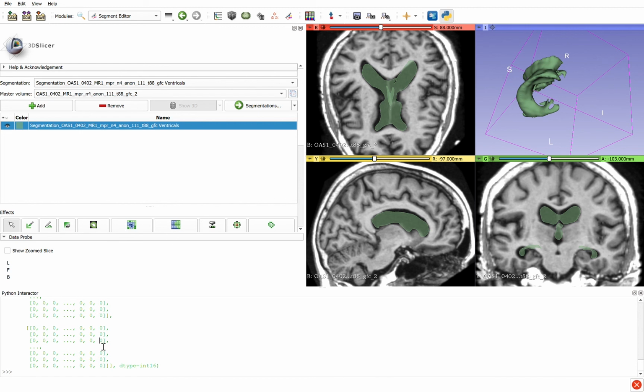We're going to create a new file name which is just the MRI file name up to 12. I want you to do up to 12 because you'll notice then it's just the first little bit of the file, which is maybe going to be a little bit easier to deal with. And then we're going to save the DICOM data out in a compressed NumPy format: output path plus file plus .npz for the DICOM data.